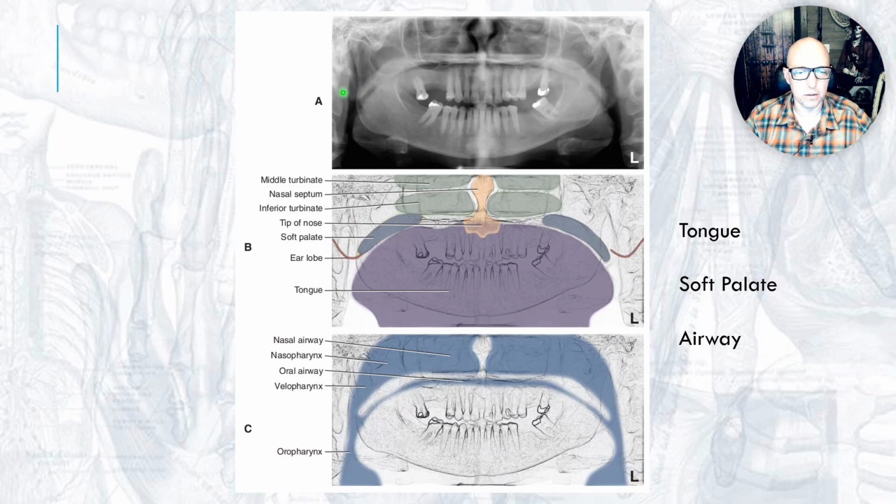The earlobe. And I've received a lot of questions about earlobes. Students ask, what is this? Because sometimes it stands out as really dense. For some reason, the patient has just dense tissues and it really stands out. In one case, the styloid process kind of overlapped the earlobe. It looked like a snake. It really looked like a snake with a tongue coming out of it. And she was confused. She said, what is this? I said, well, your patient is the heir of Slytherin, obviously.